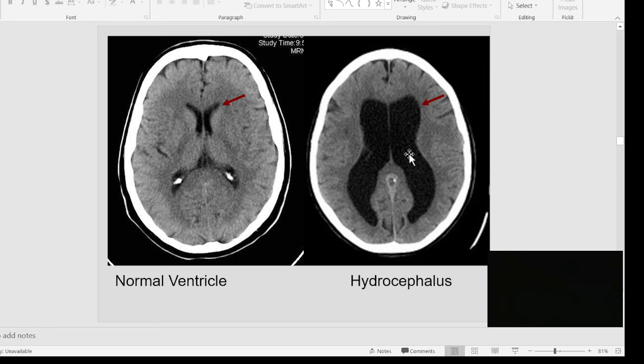Okay, now you see the ventricles are big, which means to say there is a buildup, but there's an artifact or there's a hyperintense image in the center. So it might be a calcification, so it might be an obstruction. No? So expanded, which means to say there is a buildup. So look at also here the normal, you could see the gyri and the sulci. But here in the patients with hydrocephalus, they are gone, no? The cerebral cortex is stuck to the wall, or to the skull. This is a skull window.